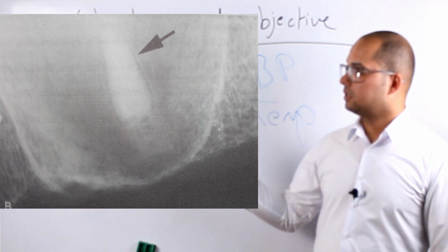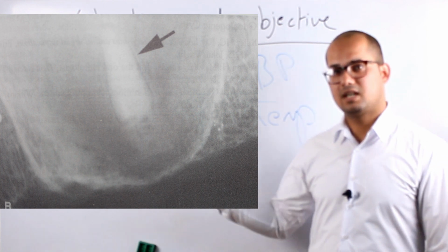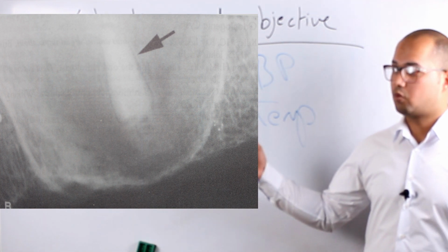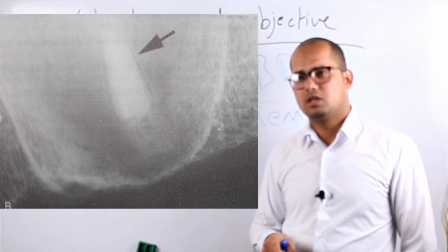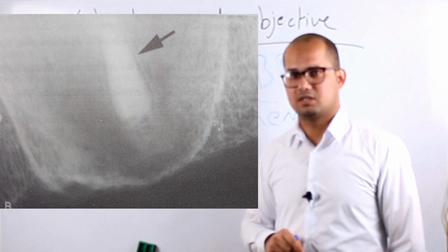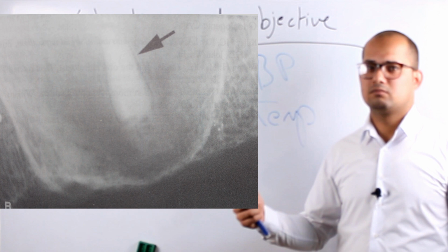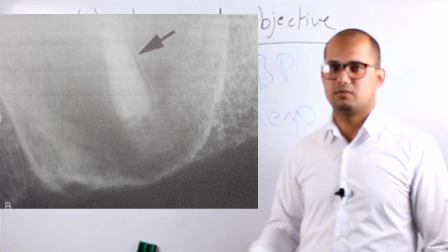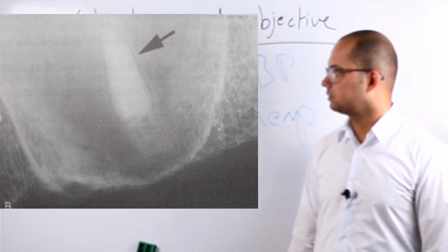This is what we see in the image. It is the root. It is not in the sinus. It is overlapped. Why? Because if you look closely, there is a radiolucent line around the root which represents the periodontal ligament space. So misinterpretation of that image leads to a lot of clinical procedures that should not be done for that patient.